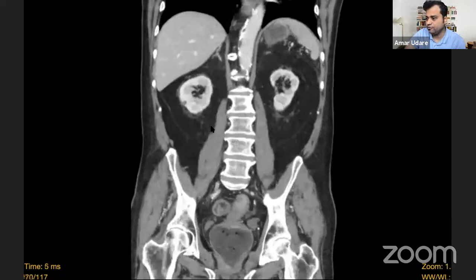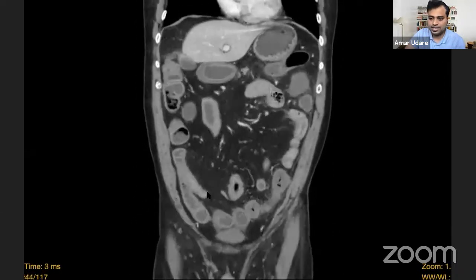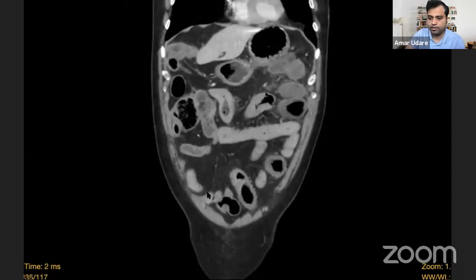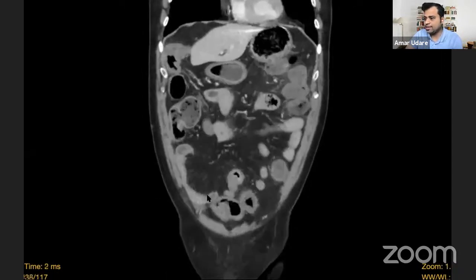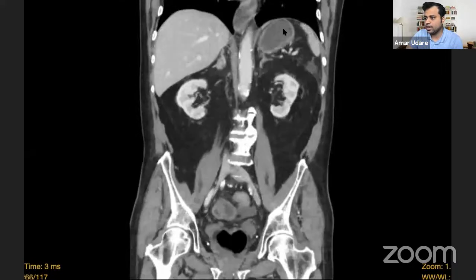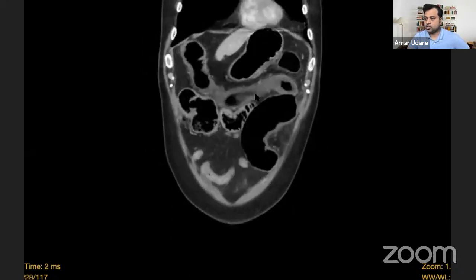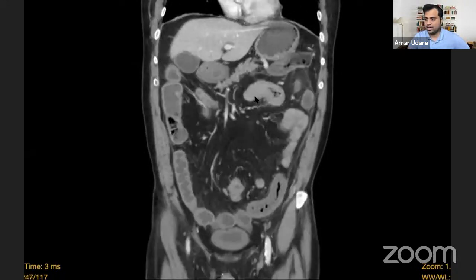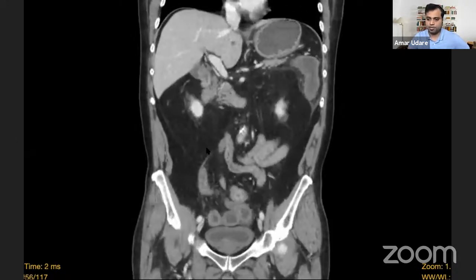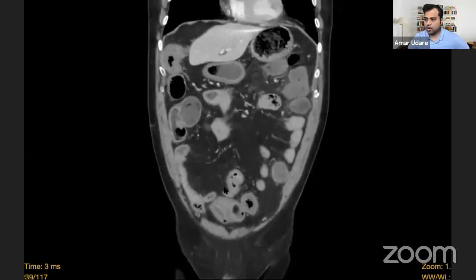Okay, excellent, Selda. You've picked up the finding. As you mentioned, there is less enhancement and bowel wall thickening. Intramural gas in the stomach? Let me see. Probably that's in the stomach lumen. This can be seen often, so that's incidental and of no clinical significance. That's probably inside the stomach. So Sharmila, that's not in the bowel wall. Nancy, correct. That's a good thought.